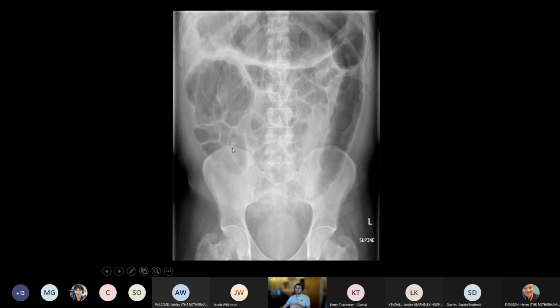Here's an example. So we've got generalized distension of the small and large bowel, but you notice here this descending colon doesn't look quite right. It all looks a similar width. Eagle-eyed amongst you might see a bit of mural thickening, bowel wall thickening down here. There's a lack of fecal residue within it. So this is an example of the lead pipe colon in ulcerative colitis.